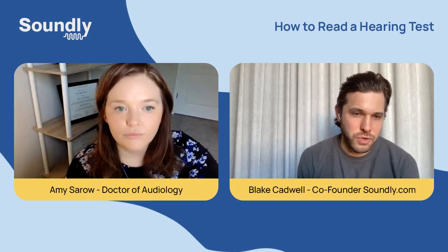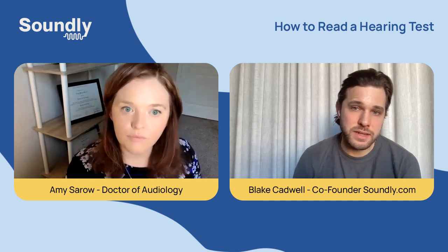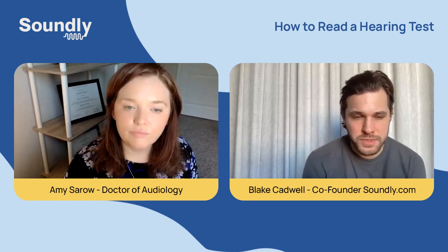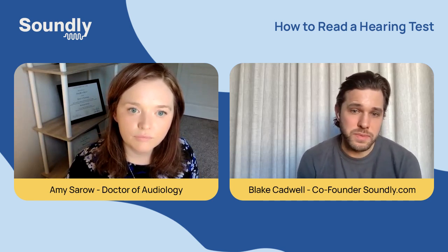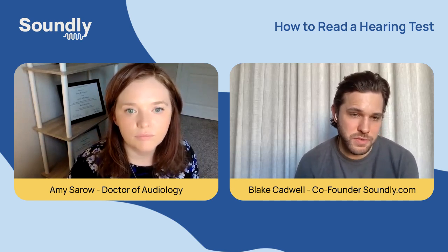If you're looking at a hearing test for the first time, especially if you've taken it online and maybe didn't talk to a professional first, it's a lot to take in, a lot to consider. But hopefully this gives you some sense for what type of hearing loss you might have, and a place to start in your research. Here on Soundly.com, we have various articles about each of these different types of hearing loss and more information on various types of hearing loss.